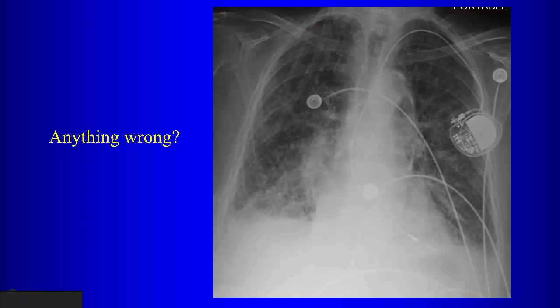Nobody's troubled by anything here? Is the lead too far left? It's way too far left. Well, it's still overlying the cardiac shadow.